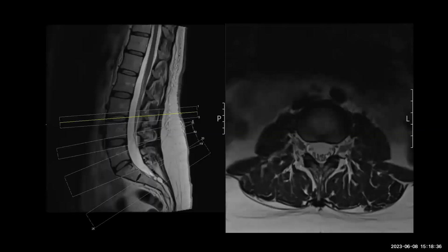Another thing is the most common thing that we're trying to address is usually disc morphology, because that's something that can be treated, and the herniation. In a normal scan, what happens is that the axial images, if you can see, they are taken quite parallel to the level through the disc. So rather than have a stack of continuous images, they take images at the level of the disc. So ideally, one will go through the inferior end plate, one will go through the level of the disc, and the other will go through the level of the superior end plate.